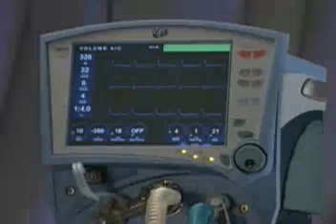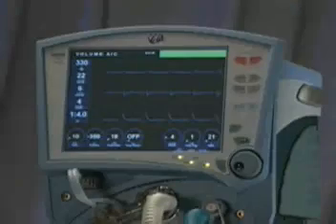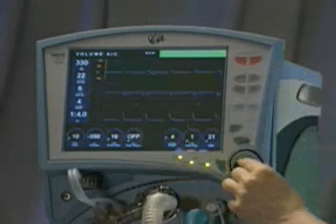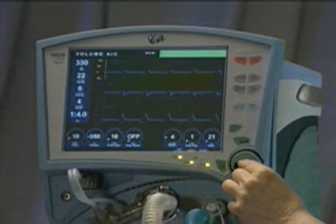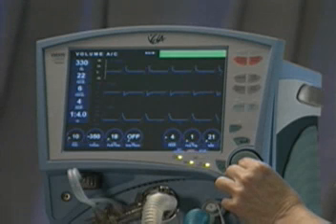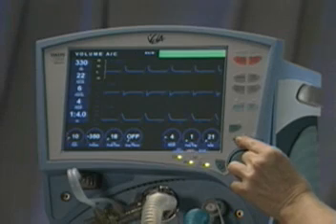Vela displays pressure, volume, and flow waveforms in any order on the central portion of the main screen display. Sweep speed and scale are easily configured. Touch the axis you wish to change. The axis will be highlighted with yellow. Use the data dial to make the desired change. Touch the axis again, or press the Accept button to accept the change.